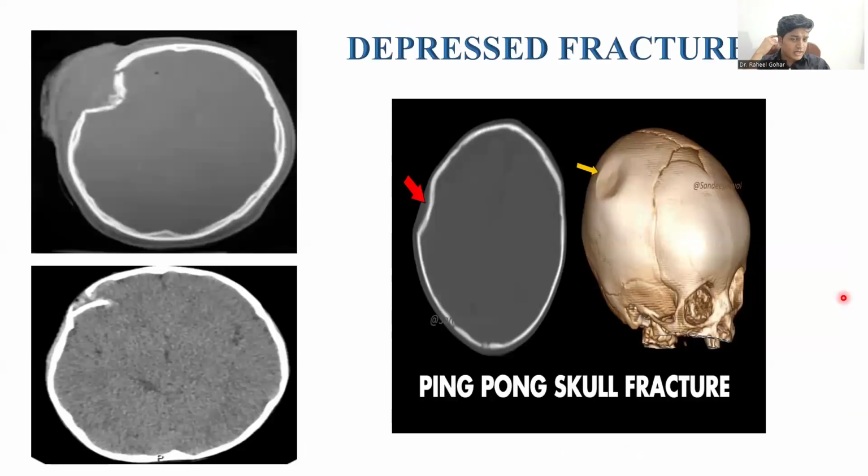Now, what is depressed fracture? Depressed fracture, as the name also demonstrates, is when the bone is going inside the intracranial cavity. Sometimes we have to operate on the fractures, and sometimes we just observe the fractures and the patient gets better with the passage of time.